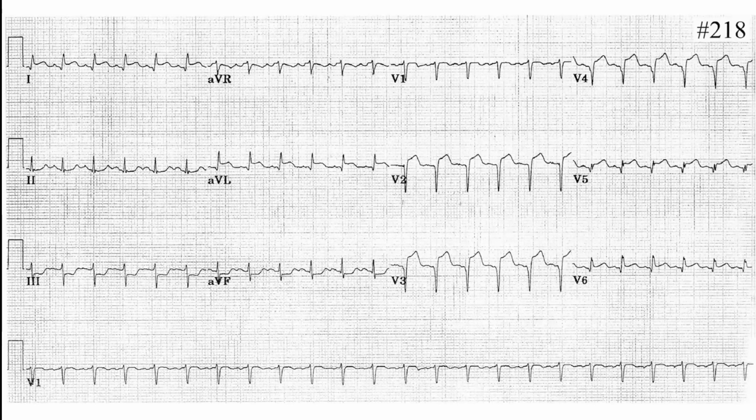This is rhythmic, and the rate is around 150 beats per minute. Yes, about 150. Okay, good. The beats are very close to each other. Very high.